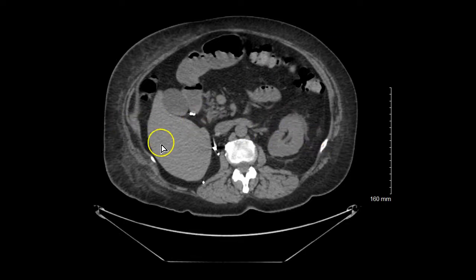Just to go through a few more points here, you can see again what the liver is roughly versus what we're actually dealing with in the gallbladder. And yes, there are some negative points in here and some positive points, but in essence this is just one pixel being analyzed. So I'm going to throw this back over here so it's not in the way. In comparison, you can see outside of the patient, air, true air, negative 1,000 is visualized here.